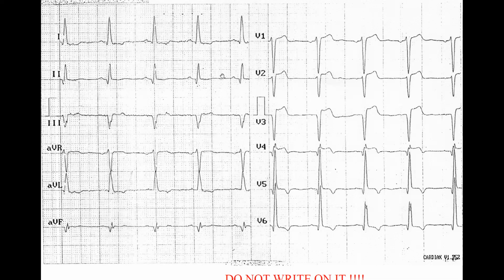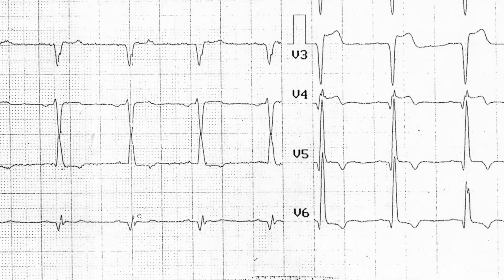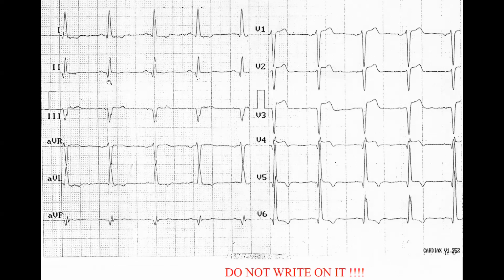Do you see pathological Q waves? Lead number 2, 3, aVF. Yes, we do. But there are no ST changes and no T changes, so that can be an old inferior myocardial infarction. Now, look at the size of the R wave in V5.